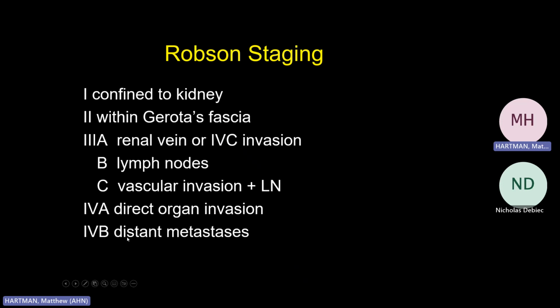And of course, the tumor tipping point of metastases. Always looking for metastases with the cases of RCC, looking for bony lytic lesions.